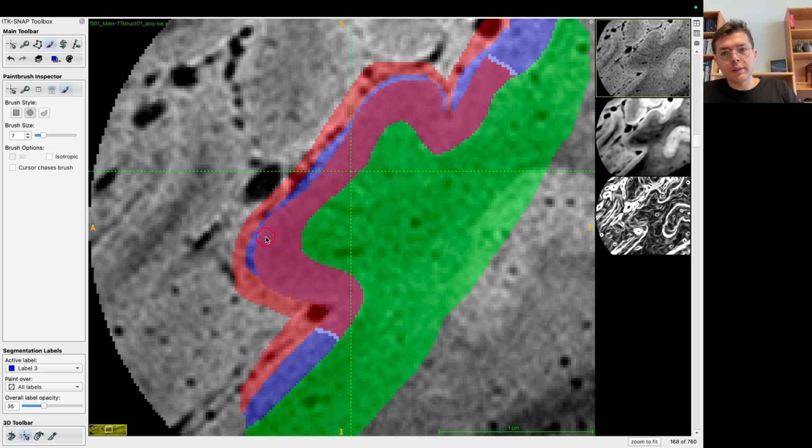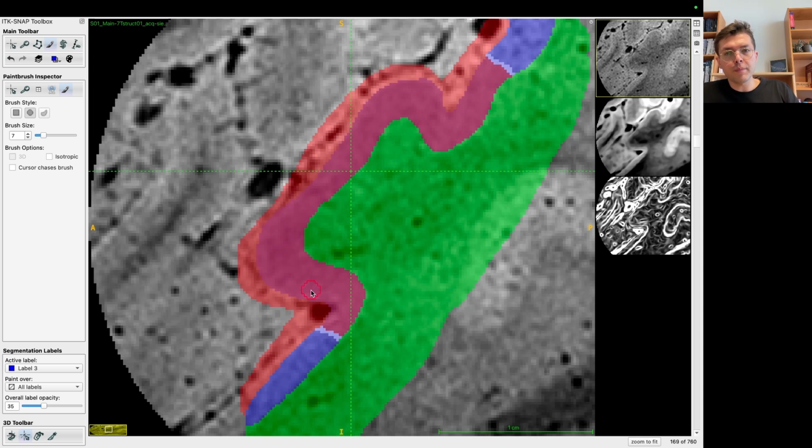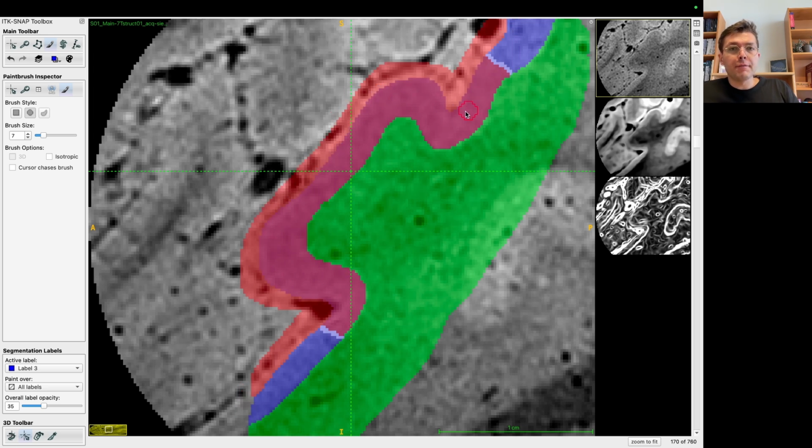And of course, once I am done with this step, I run rim polish one more time because it regularizes the manually edited geometry a bit better to make sure that things are sharp and smooth. Then from there, we will proceed with the other steps of this analysis.